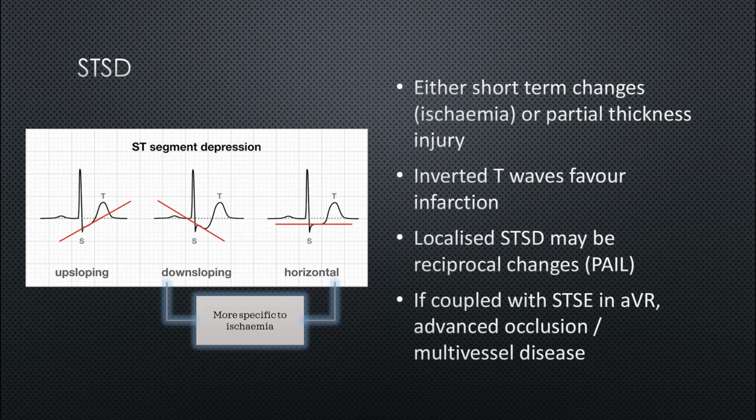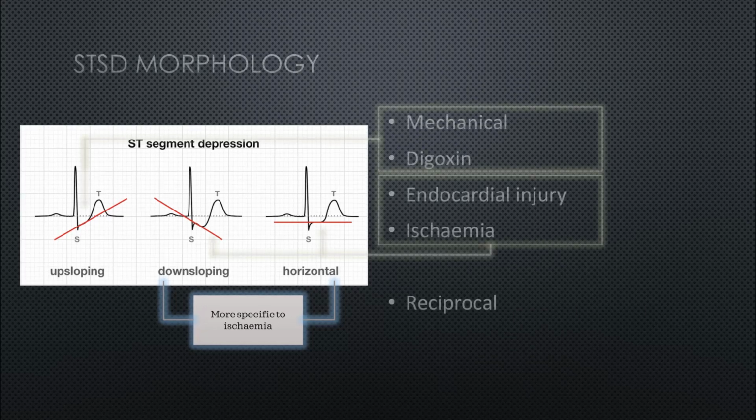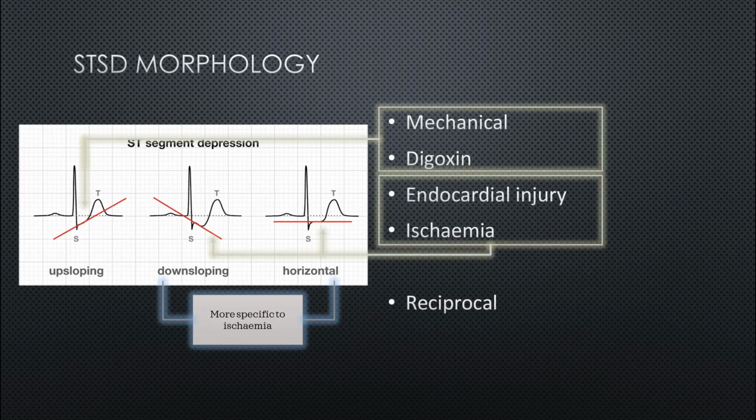I'll make the point now that it's not diagnostic of an AMI, but it certainly adds evidence to the fact that urgent consult is required. So without troponin testing, differentiating ST depression between reversible ischemia and a non-STEMI is problematic. And it's just safer to assume and to manage all cases with worrying ST depression as possible infarcts until it's been proven otherwise.